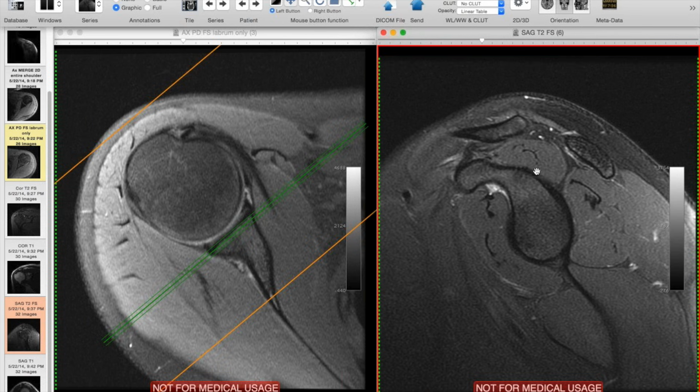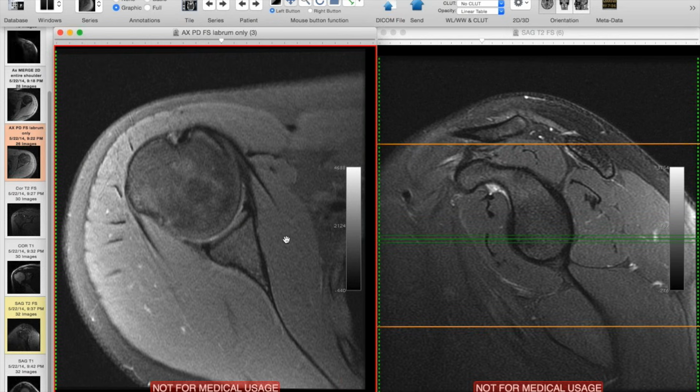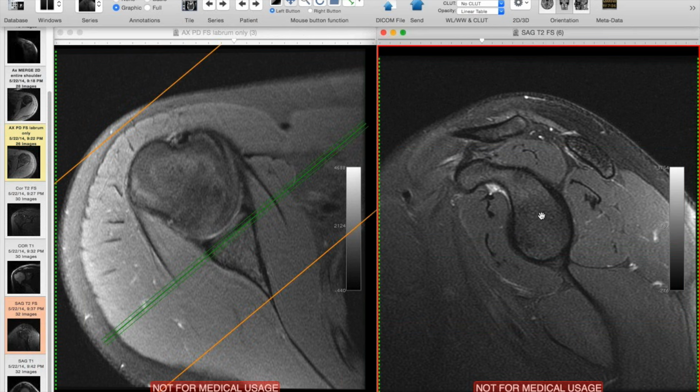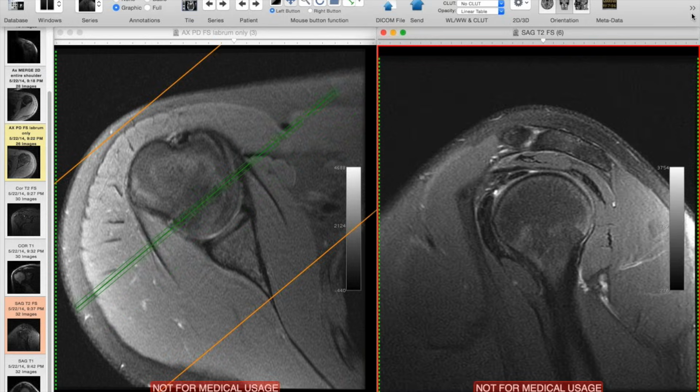So normally you'd have a 12 o'clock position, and then anterior is going to be 3 o'clock, 6 o'clock, 9 o'clock. And if you look at the reference of the axial images to the glenoid, sometimes you think you're more inferior than you are on the axial images, but the reality is in this patient, the most inferior image that we're seeing labrum here is in fact fairly antero-inferior along the glenoid, and that's where tears often occur. So that's an important point to keep in mind.